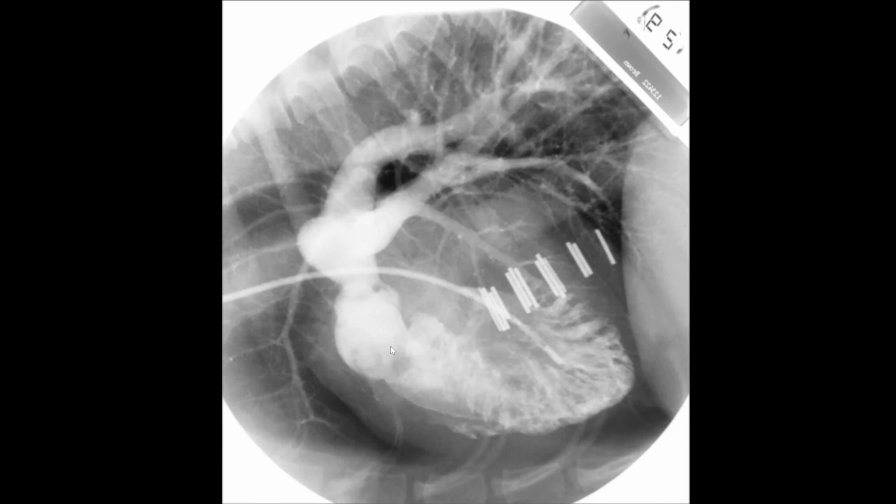And now we have contrast that's coming out. We got a little bit of a bulge up here in the right atrium. This is the narrowed area. That's the stenosis itself in the region of the valves, the pulmonic valves. And after that, we get this great big MPA bulge that lives right up in here. And that's because we have this high pressure jet that's like you're putting your finger over the hose, and it's squirting this high pressure jet of blood inside the main pulmonary artery segment. And over time, it becomes big and dilated.